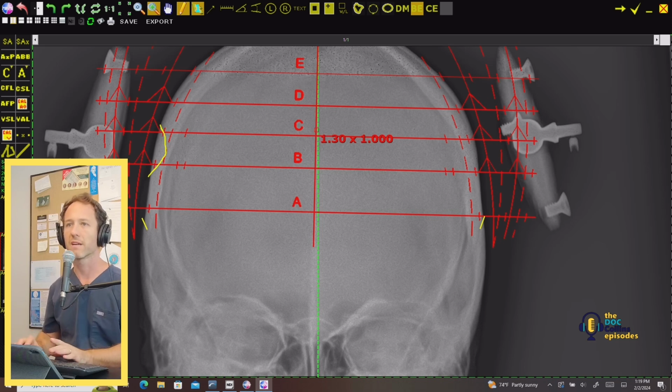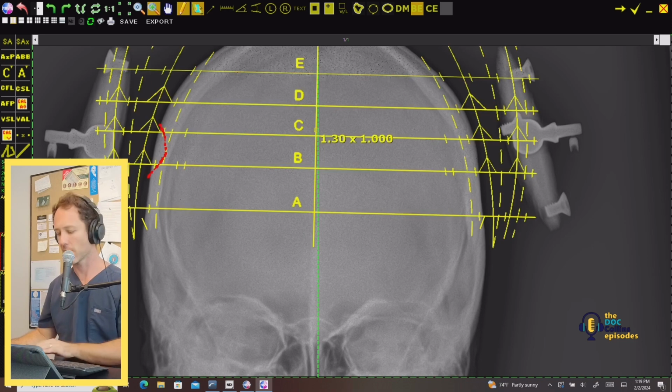And kind of work back and forth and sort of avoid this area here. So I'd be looking, more of my reference would be between here and up here than that true, kind of zone that's 1 to 2 inches above. So you could kind of toggle back and forth and get it dialed in while ignoring that B to C range would be an example. I don't know if that helps describe it well, but two zoning.